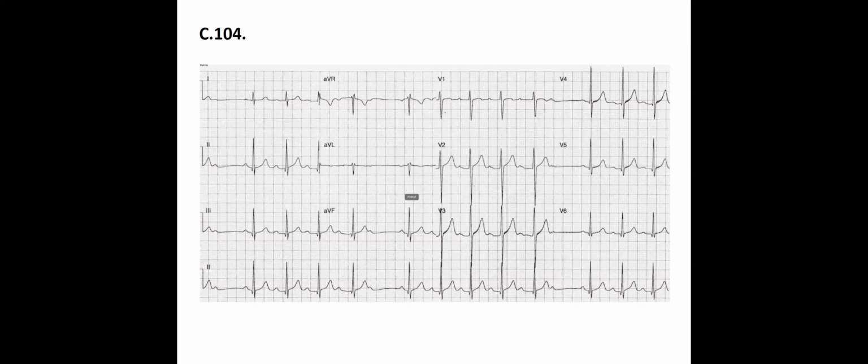So I said that mine was not rhythmic and it had a beat of about 60 beats per minute with the normal axis. We can see that there's progressive lengthening of the PR interval. And after a couple of beats, one of the P waves is not followed by a QRS complex, so there's a dropped QRS complex. So I concluded that it was a second degree AV block Mobitz type 1. Exactly. That's it. Okay, good.